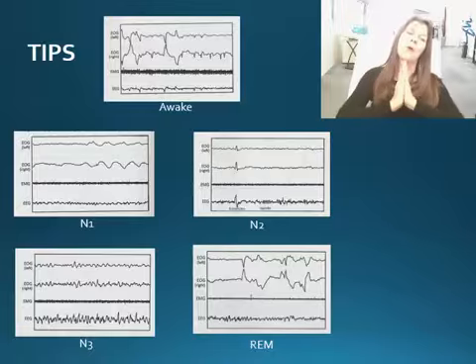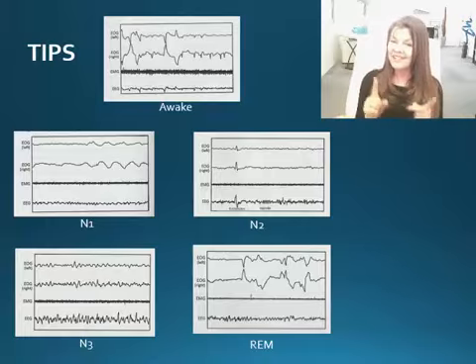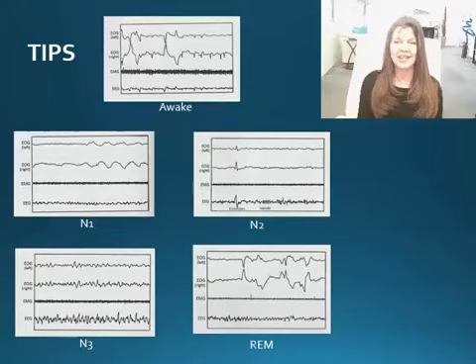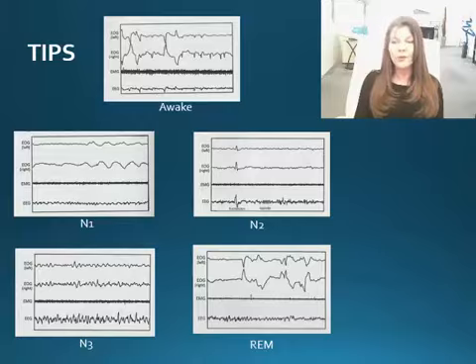Now let's look at REM. Wow, eye movement is all over the map here, right? Notice there is no discernible EMG, but look at the EEG. See why these waves are called sawtooth waves? That notched appearance? If you compare that with awake, and N1, 2, they actually most closely resemble awake. But the best way to tease them apart from awake or N1 are these sawtooth waves. And there's no discernible EMG because of something called sleep paralysis.